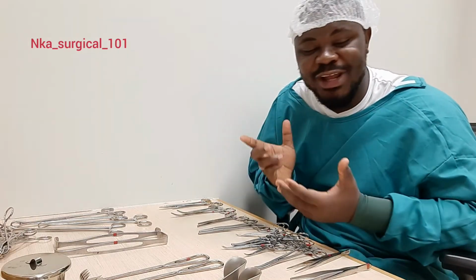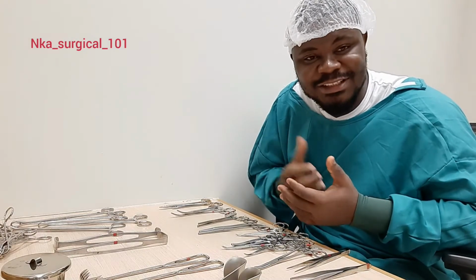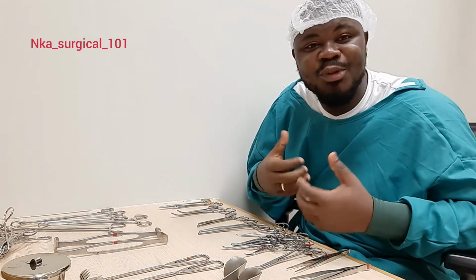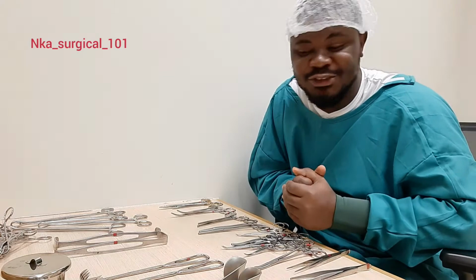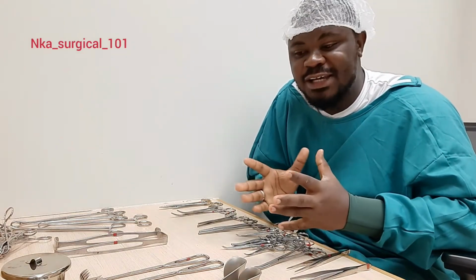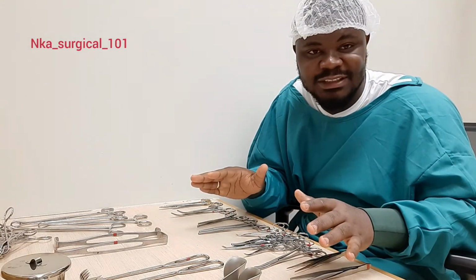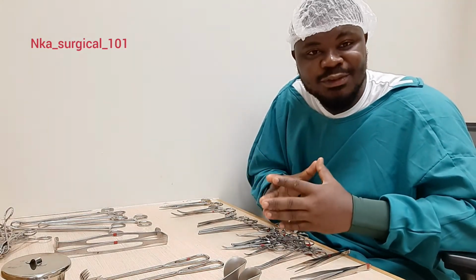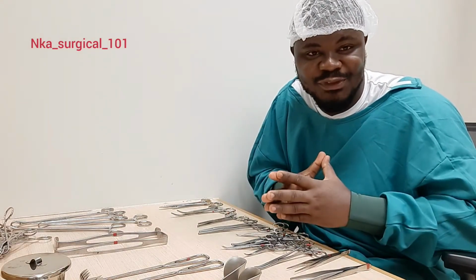And today we are going to do another classification of surgical instruments. Now we know the 10 classifications of surgical instruments: the cutting and dissecting, the probing and dilating, the exposing and retracting. Today, I want to talk about another classification of surgical instruments where surgical instruments are categorized or classified under two main streams. The first one is the general instrumentations. When we say general instrumentation, it means that in any particular surgery that you do, you need such basic or such general instruments for such a surgery.